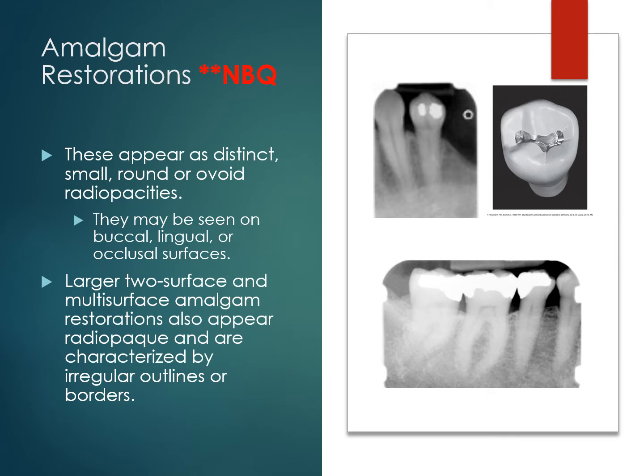So, amalgam restorations. So, on a one surface, oh man, you try writing with a mouse.